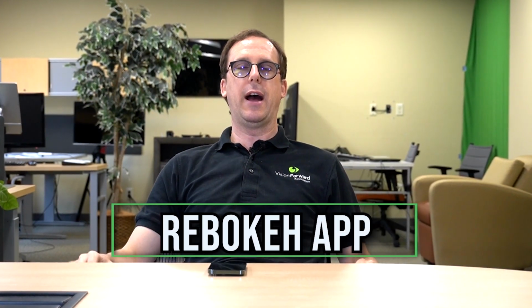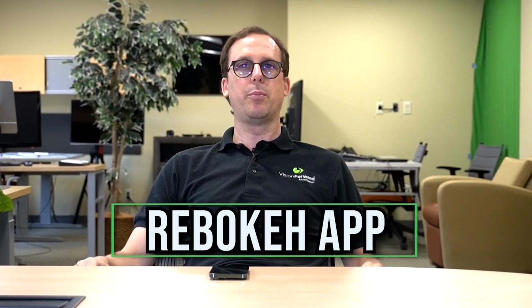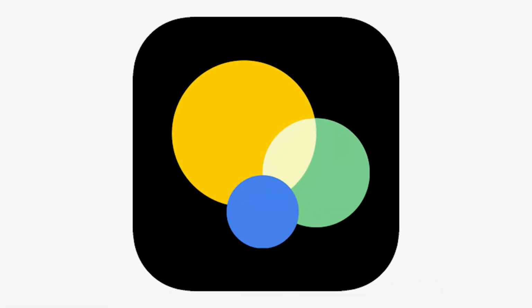the ReBokeh app. Now this app has been designed to assist people with low vision to read just by using their cell phone. But how does it measure up to the built-in iPhone Magnifier app? Well, you're gonna have to keep on watching the video to find out. So let's dive in and take a look.